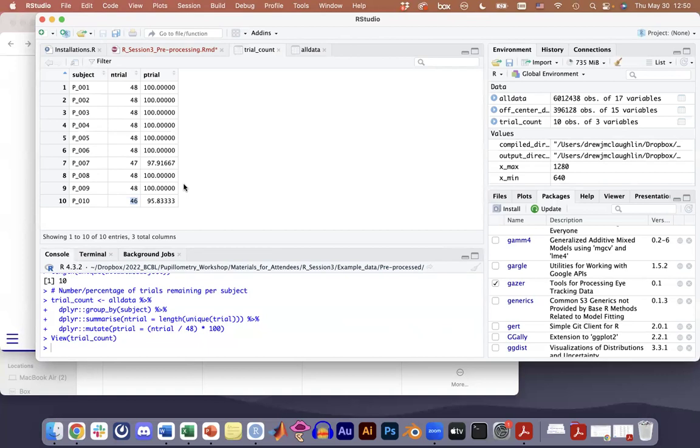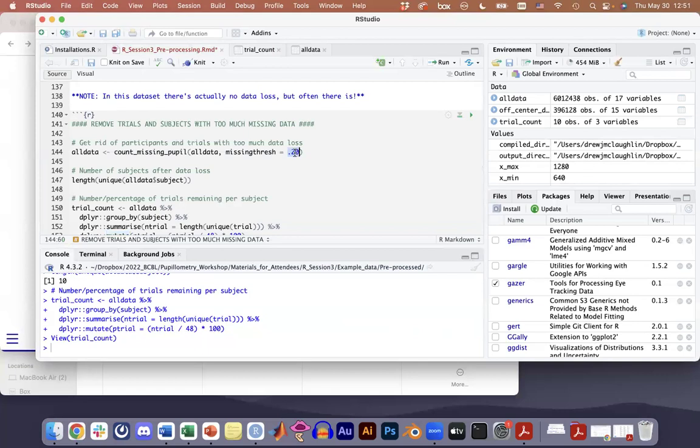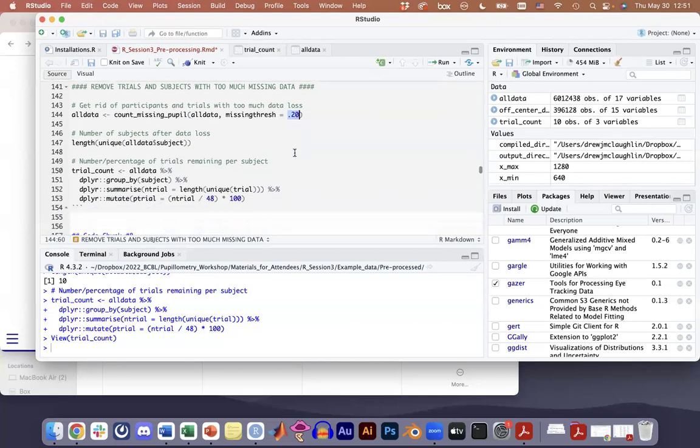So if you want to apply a different threshold at the trial level versus the participant level, you could essentially run this function on, how would you do this? You'd set it to 50%, for example. Actually, no, the function would have to be rewritten, I think. You write 2 functions, one for trials and one for participants. So I think it would need to be rewritten. I'll put that on my mental to-do list of things for my toolbox that I will hopefully eventually make.